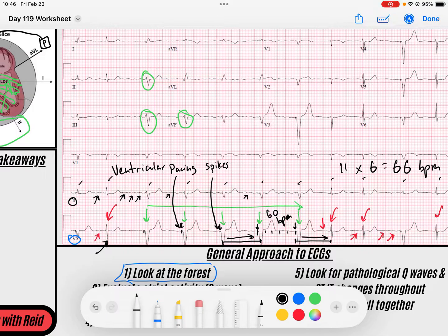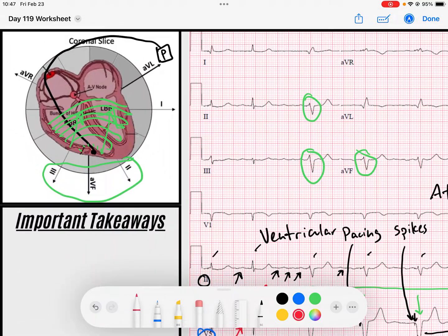And so what we have here is we have somebody who's in atrial fibrillation. And so you're probably asking, but I thought atrial fibrillation has an irregular rhythm. Well, if somebody has atrial fibrillation with a pretty significant AV node block, then those fibrillatory waves that are occurring here in the atria that are going to be fibrillating all around, right, and they bump into the AV node, and that's why the AV node usually captures it and sends it down.